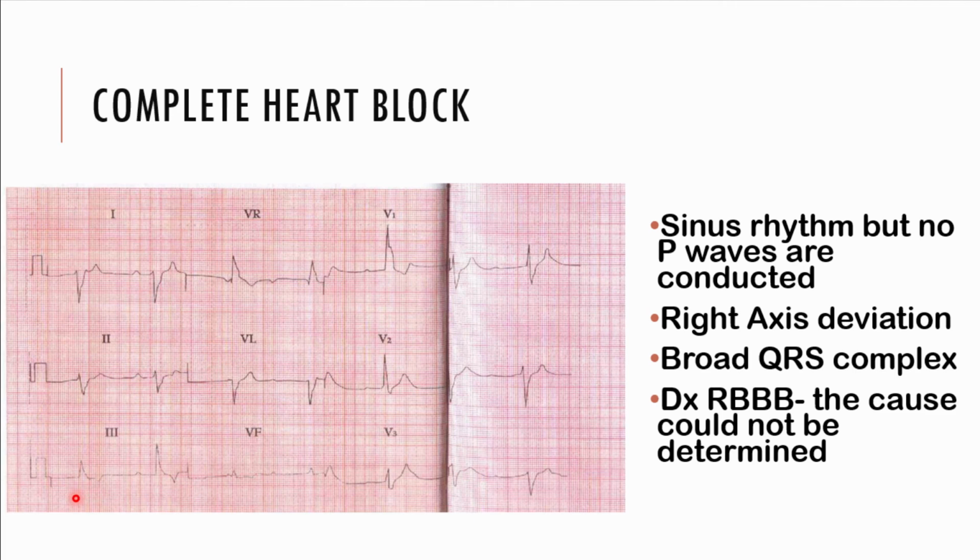Then let's look at this here. You have a QRS complex and a T wave here, a P wave, a QRS complex. Okay, fine, fair enough. The rhythm here is fairly regular, so you can simply count the squares in between these QRS complexes. I won't spend much time on that because I covered that when we were talking of interpretation of an ECG. Then we look at cardiac axis.